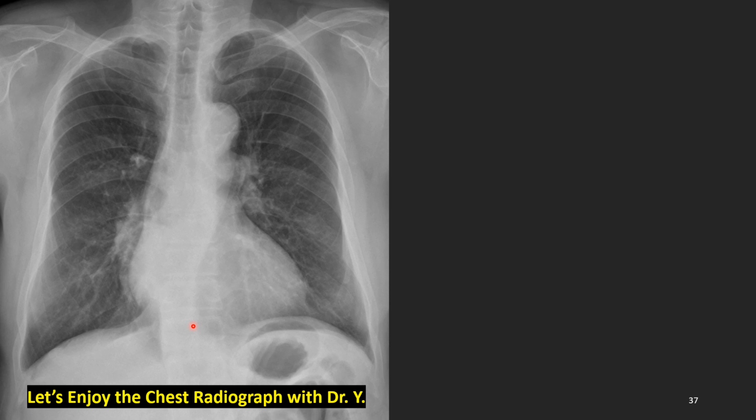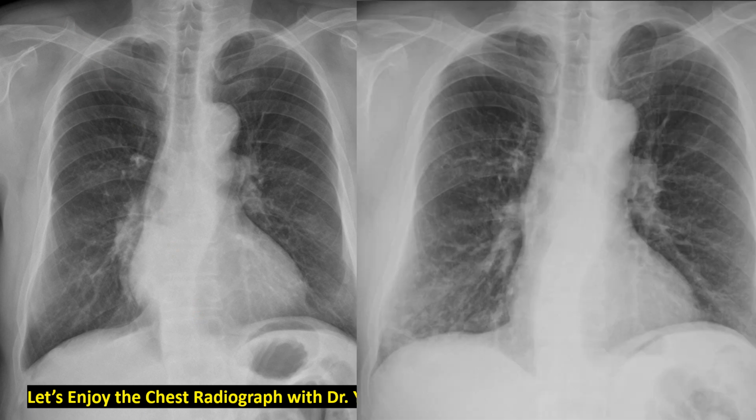I think you have found something because you are already trained so much with missed lung cancer session. Yes, that's correct. You got it. Right heart, retrocardiac or precardiac, right heart area. Right side images 1 year ago, last year.